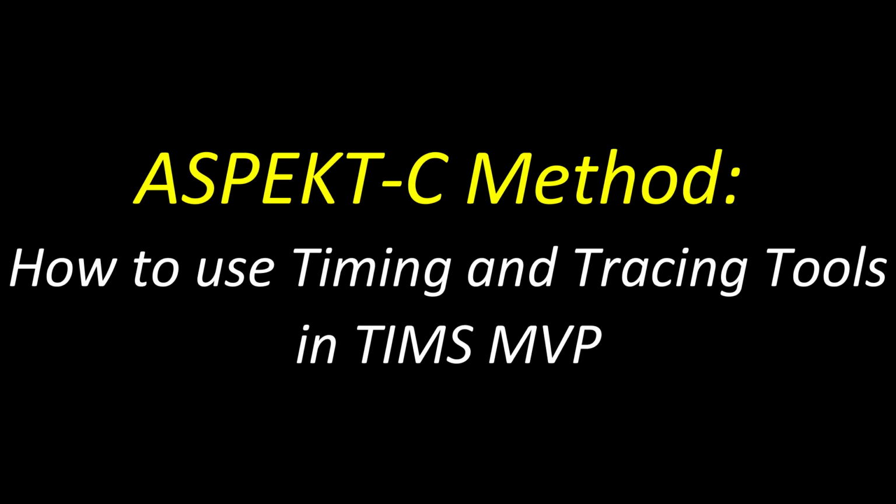Hello everyone. Today we will be learning about how to use the timing and tracing tools in the TIMS MVP software to evaluate swallowing safety and efficiency according to the ASPEKT-C method. Please note, this video was developed using TIMS MVP review software version 5.1. If you are using a different version, the functionality may be different.